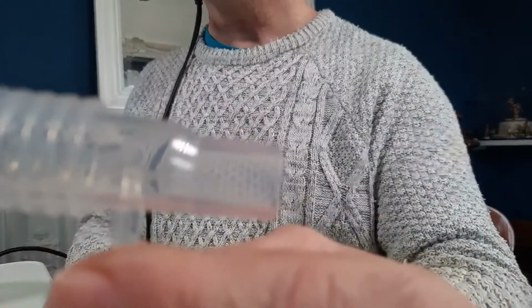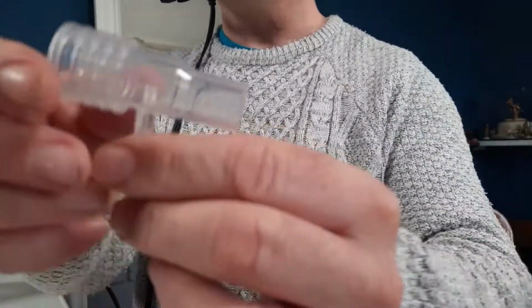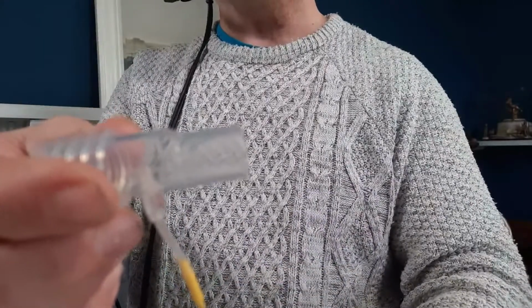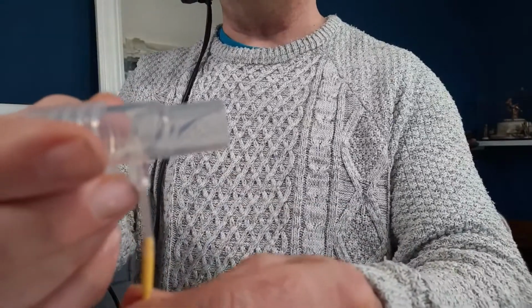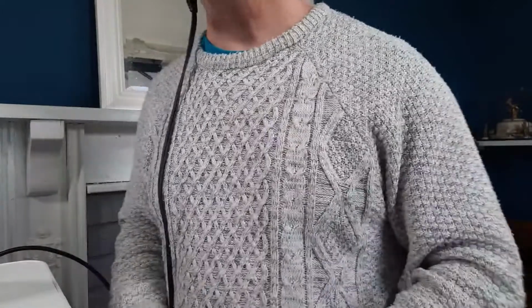No, it's not going to focus, it's focusing on me. But inside is a tiny little channel there that picks up the CO2 and then takes that CO2 down this tube all the way down to the monitor, which eventually will give us a number and will show the CO2 waveform.